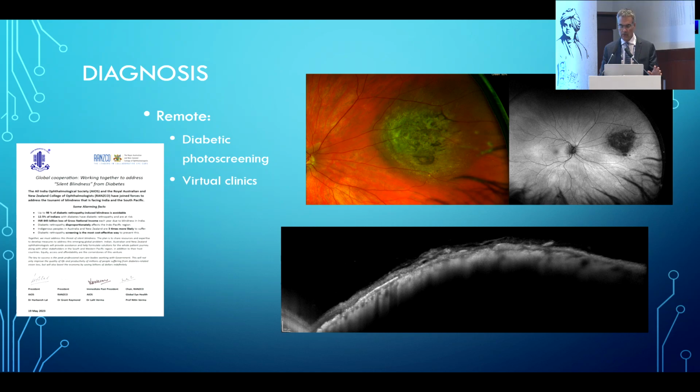I also run a virtual multimodal imaging tumour clinic in which I review the images of patients without seeing them to rule out benign lesions such as this nevus, which you can see has no autofluorescence on the fundus autofluorescence, no fluid on OCT, and is relatively dark on autofluorescence.